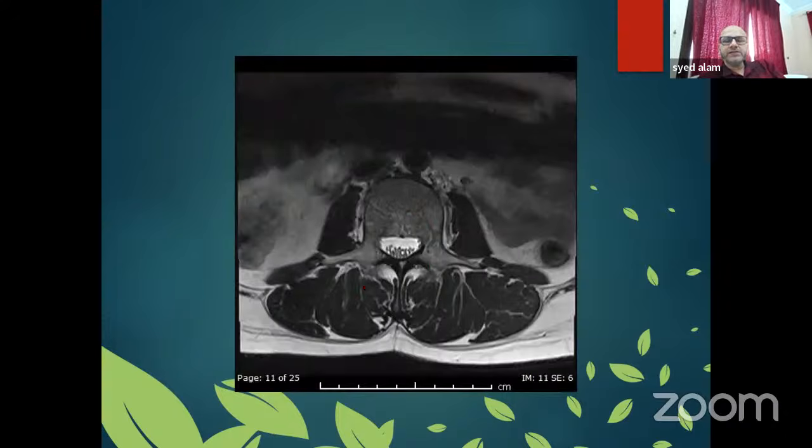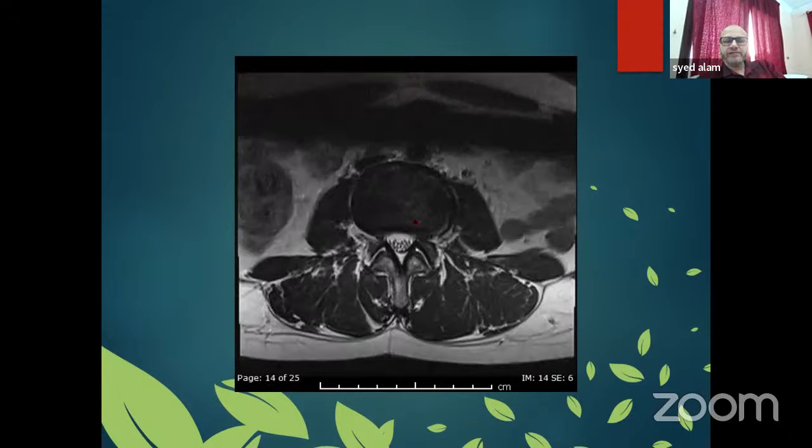And these are the axial images. So we can see these are the pedicle. This is psoas muscle. This is the paraspinal muscles. This is the important facet joint. This is the facet joint. And you can see here, this is the ligamentum flavum. This is the ligamentum flavum. So when this lining is flat, it's normal. When it is convex like this, too much convex, that is abnormal. Sometimes bilateral ligamentum flavum hypertrophy can cause some compression of the thecal sac or canal stenosis.